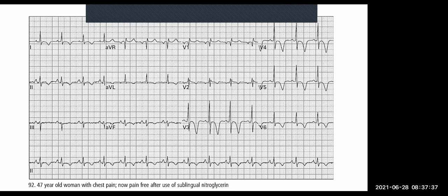Number one, we have a whole lot of ST depressions. So this could be an NSTEMI, for example, all right? And if it were an NSTEMI, we would re-ECG after 10 minutes or 20 minutes or at hour intervals and look for dynamic changes and things like that, all right? And if there were changes, then we would say, no, this is a high risk and not just an NSTEMI, this could be a STEMI.